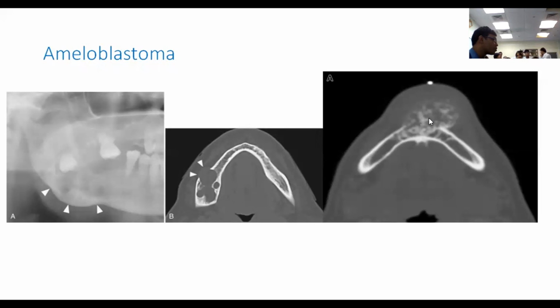When you have some osseous component in this. Only in pure ameloblastoma, you will have lytic areas, and then it will expand. The lower down, the more major the expansion will be. So you see the bone expanding in this direction and that direction. That kind of picture. So buccolingual. When they do the clinical examination, they will see that this and this portion is dilated, so probably it is an ameloblastoma. Sometimes you can palpate the lesions. In ameloblastoma, you can palpate the lesions most of the time, unless they are very small, like radicular cysts and all those cysts, which we cannot palpate.